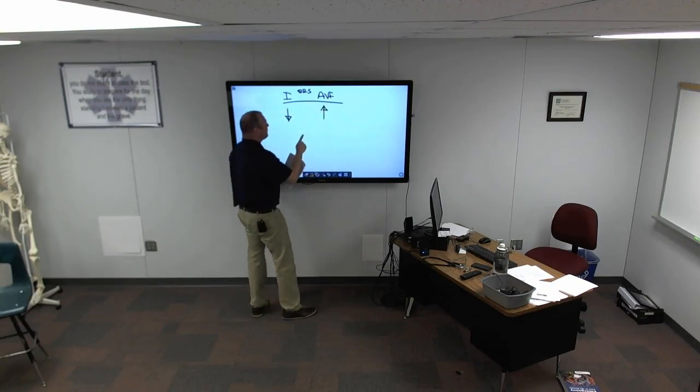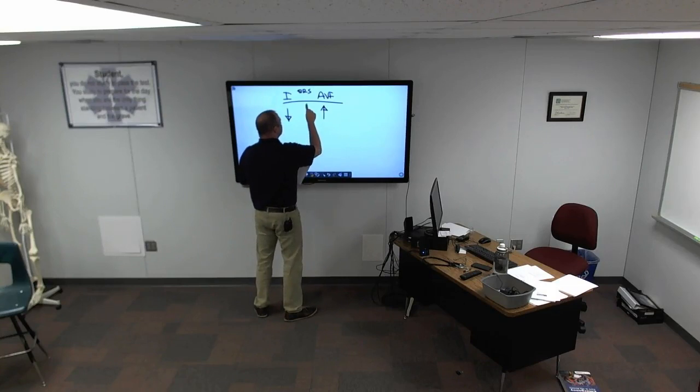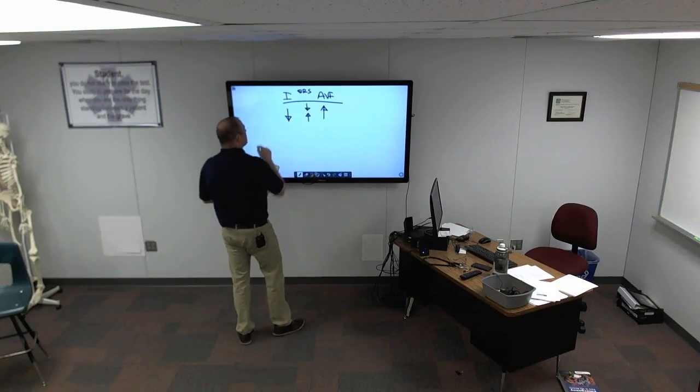Now, once again, we're going to put these two together. I got them all messed up, guys. So we're going to put this one here and this one here.